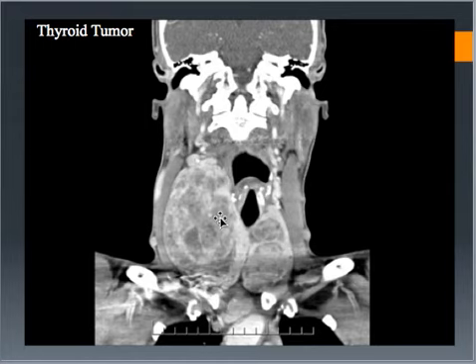This is a thyroid tumor, so if you're looking at this image here, if it's hard to kind of tell, here's the base of the skull, and here is the C2 vertebrae right here in the dens, and then you're coming down here, and here is this big tumor on the thyroid. So it's actually very large.